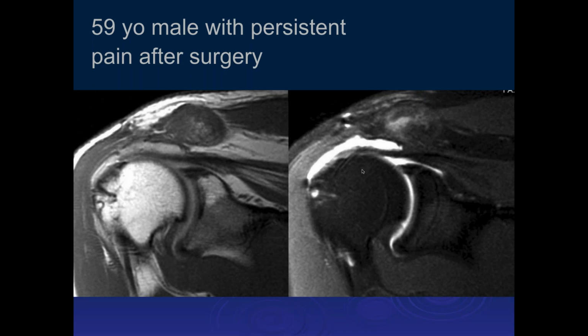Okay, right. So what we're seeing here is the proximal retraction of the musculotendinous junction. Now, sometimes when they do the repair, they don't bring the tendon all the way back, but sometimes you can't. So this is probably tendon here, but in this particular case, this high signal intensity material here is almost certainly not tendon. This is all probably scar in situ. And we can see that there's fluid going into the subacromial subdeltoid bursa.